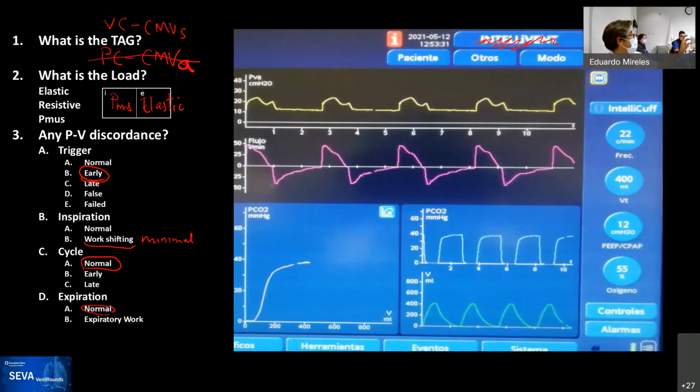That's beautiful. So you just highlighted that sometimes we get sabotaged by the ventilator. The Servo U will put a waveform that simulates how it would look at the Y, right? If the sensor was at the Y, where is the sensor on this ventilator? There's a proximal sensor. It's at the Y, right?